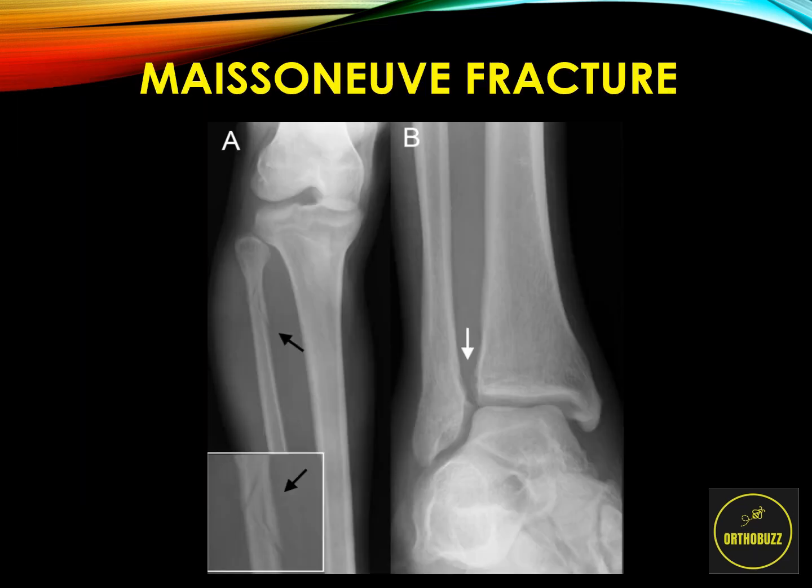It's important to be aware that you may get x-rays like we see in B, where we can see there's something going on here at the distal tibiofibular joint. There seems to be a greater distance than we would otherwise expect. And therefore, we look for a fracture, as it must be associated with that, but we can't see it on the ankle x-ray. It's important to note that we need to look higher up for the fibular fracture, as it can be a very high fibular fracture closer to the knee joint than the ankle joint. And if we get x-rays of the proximal fibula, we'll see that there's a high Weber C ankle fracture.